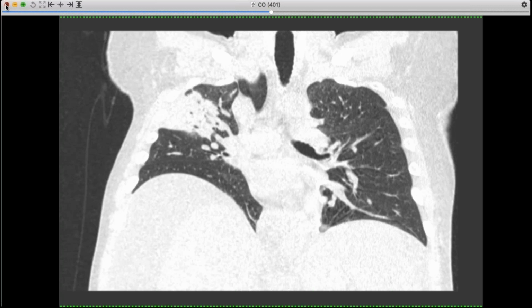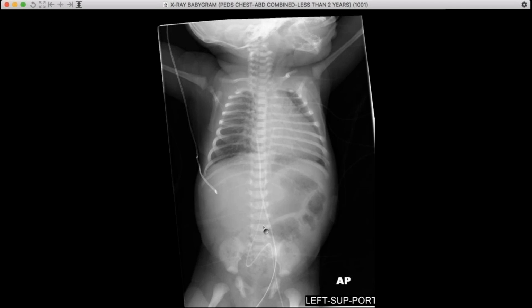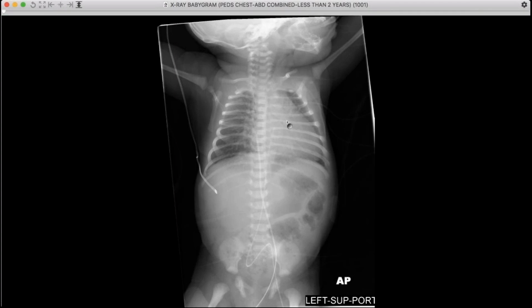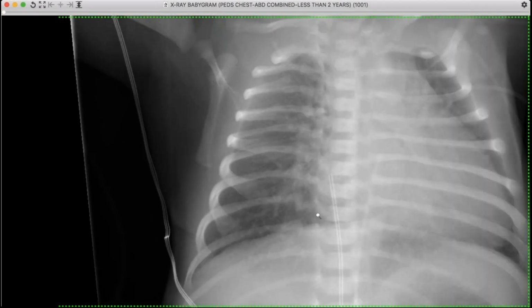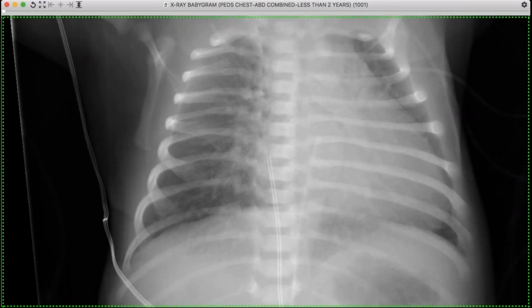Now I've got two fun aortic cases that were shared with me by my colleagues. This is a baby who presented at birth cyanotic. You can see some support devices in there. I can't really comment on the lungs. Magnify this up here, but it doesn't look like overt shunt physiology, but to be honest, it's been a long time since I've seen a lot of babies.